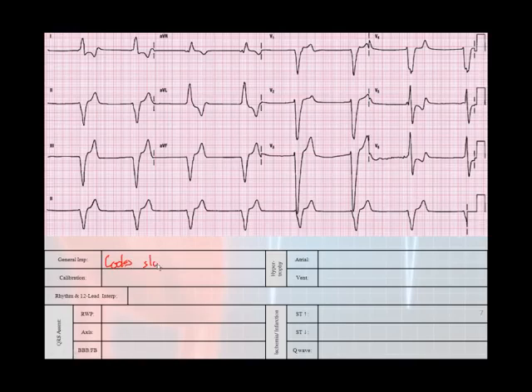look slow, with, that's supposed to be C with a line over it, ugly morphologies. Now, as you go through the interpretational process, you will eventually find out what exactly you're looking at and why it looks the way that it does. But right now, I just want to concentrate on general impression.